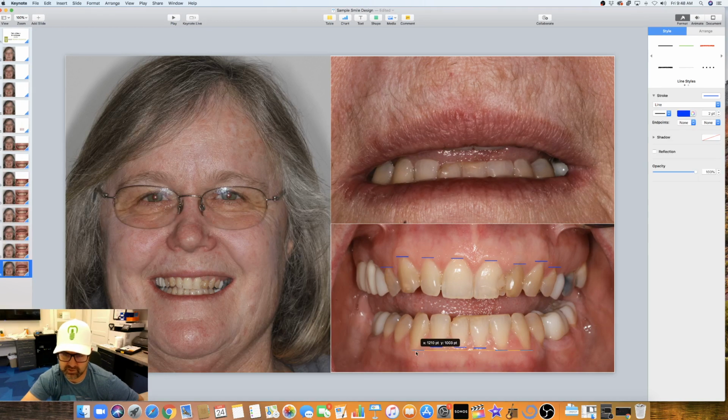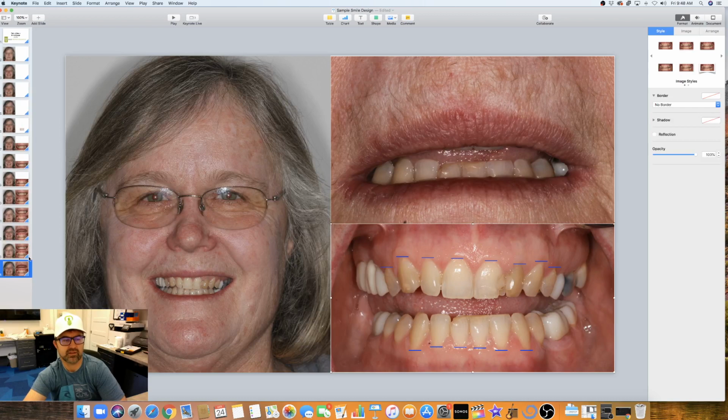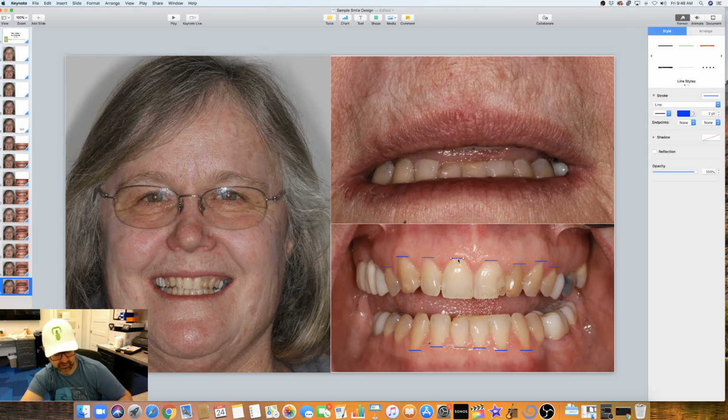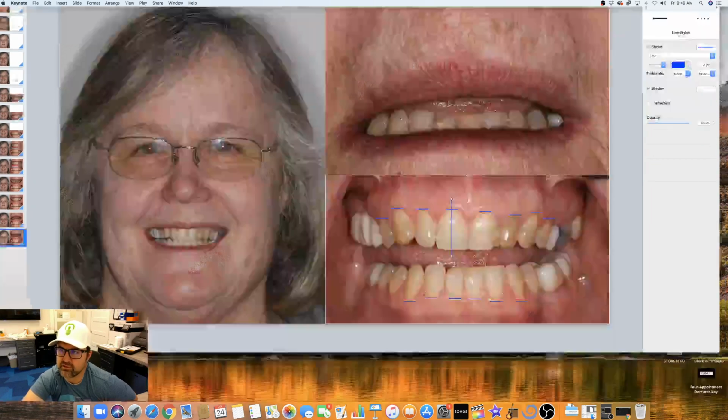And so this helps in that regard. You can even do the same thing on the mandibular teeth. At this point, I'm going to copy this slide. Now we've retained those lines, and I'm going to copy this and make it longer, long enough that we can put it on the tooth, probably at the center of that highest point, and now start to change the orientation of that.